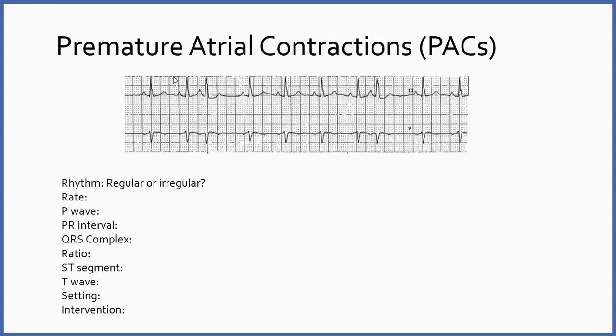Locate the T waves, and we notice that they're upright and rounded. This one, P wave, QRS, looks a little different. But remember, this is my early beat, so I'm going to come back to that. T wave, T wave, T wave. So upright and rounded. Now hit pause and measure the QT interval. All right, if you're back, you should have gotten the QT interval at 2 big boxes, so my QT measures 0.4 seconds, which is within normal limits. So with that information, I can say that the underlying rhythm is a sinus rhythm.